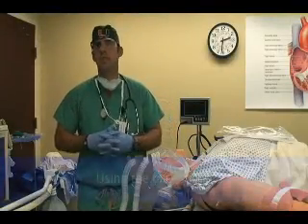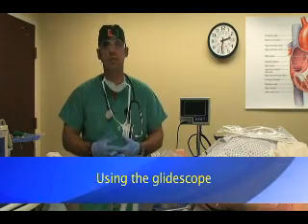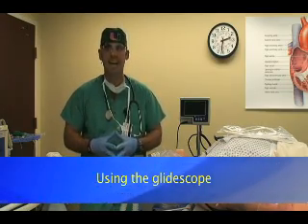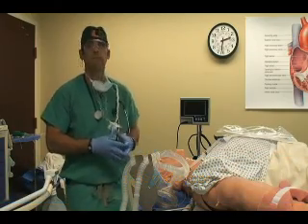In this unit, we're going to discuss using the Glidescope. What is the Glidescope? Why is the Glidescope different? When do we use the Glidescope? How do we use it? And different model options. So first of all, the Glidescope.